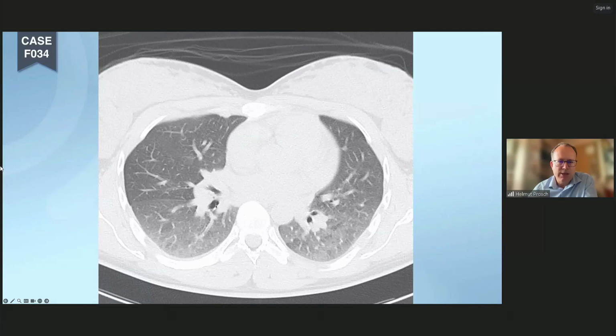These dark areas, that's an airway, that's the right lower lobe. And usually the lung parenchyma is in the range of the lumen of the airways, but that's much more gray. So that's ground glass. And now it's easy to say, and very, very misleading, that if I see ground glass in a patient with a connective tissue disease, it must be NSIP. I discussed the potential differential diagnoses already with you, but there are more.